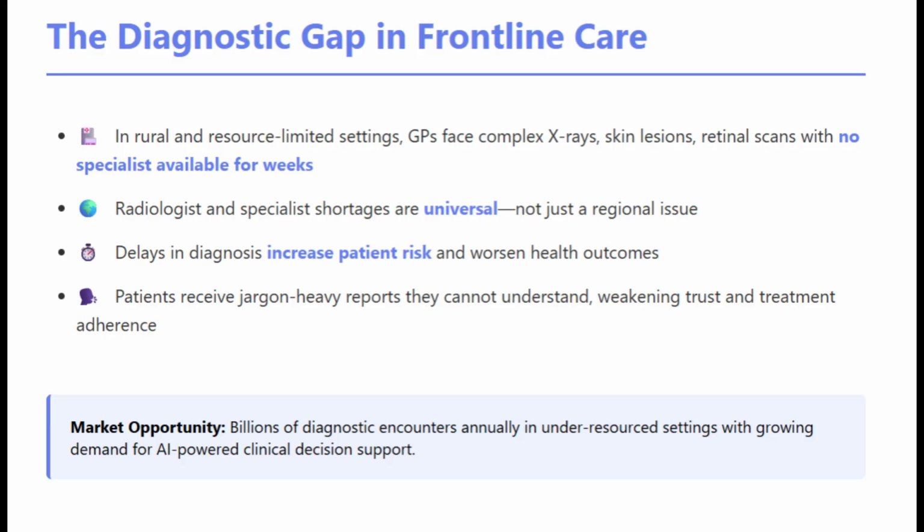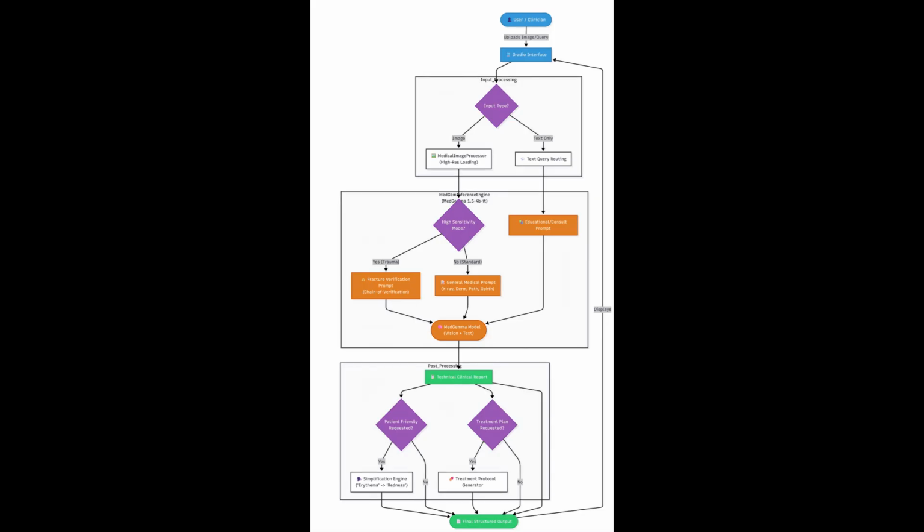MedGem isn't just another X-ray reader. We realized that a true AI assistant needs to be as versatile as the doctors it serves. So, we built a universal clinical assistant. Let's peel back the curtain and look at the code powering this engine.